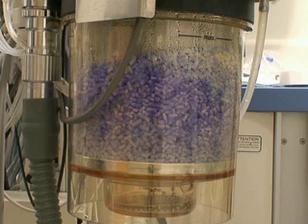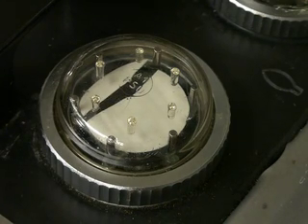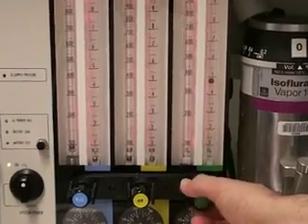This can occur if the carbon dioxide absorber in an anesthesia machine is chemically exhausted, if a valve in the ventilator circuit is not functioning properly, or if the flow of fresh gas is insufficient. An elevated baseline can also be seen if the device is calibrated incorrectly.